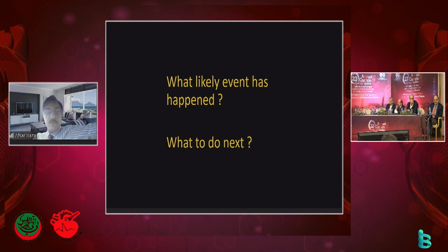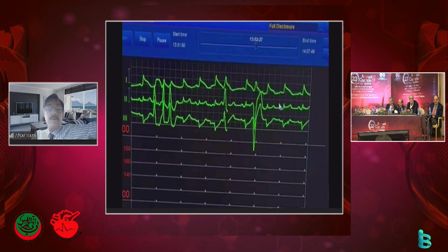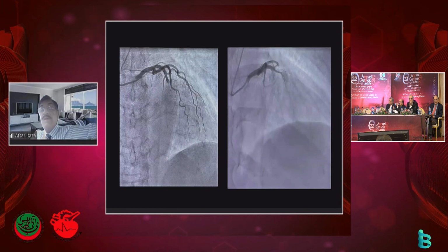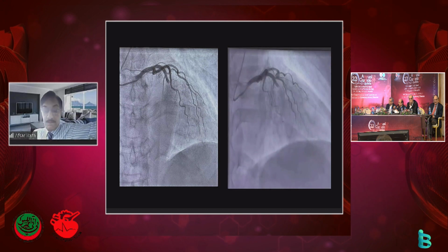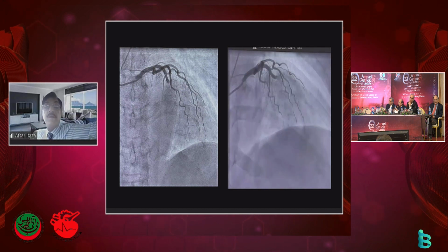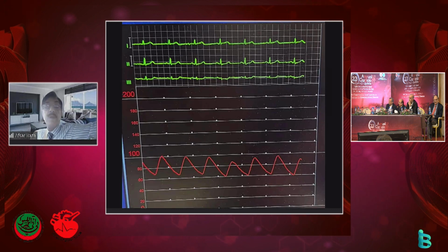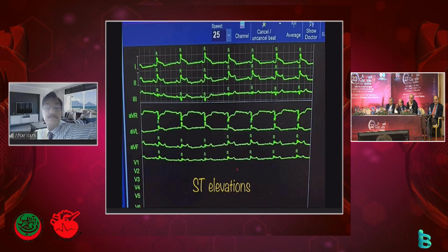If you show us the previous slides, before the last shot. Yeah, so these are the last pictures, and afterwards when you show the ECG, leads 2 and 3 are showing some changes. Look at those leads. There's some elevation in those leads, 1, AVL, 1 and 2. And in AVF there's some elevation also. So in this situation, what would you do?